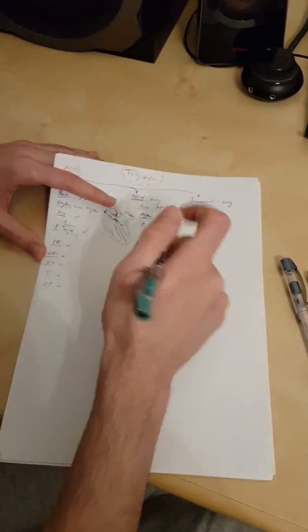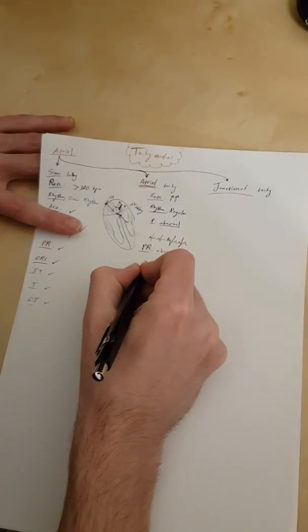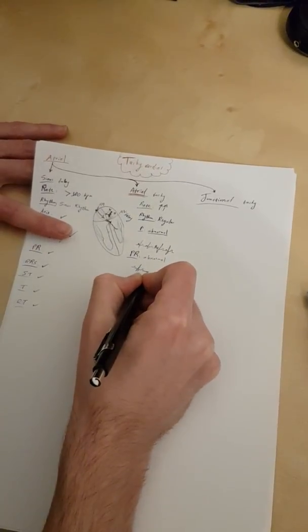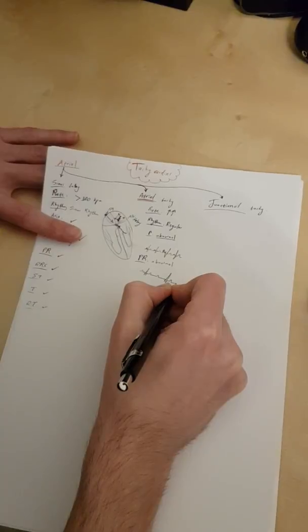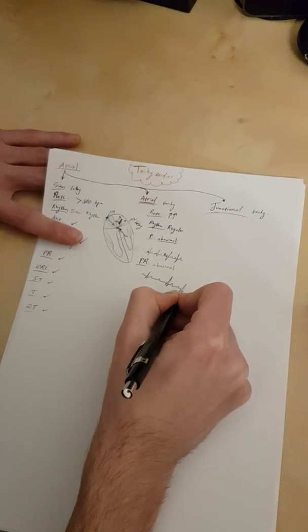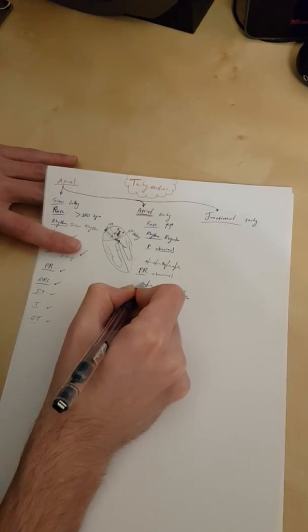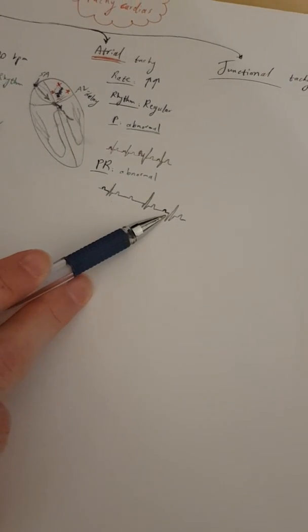So, but I'm just telling you this so you can expect it. So the PR is gonna be also, sorry, this should be in green, okay, abnormal, and this is also abnormal. And here's a hint. There are sometimes you might find in one ECG a P and then a PR, and QRS, then a T, okay? Then you find a P and a long PR, QRS, and a T. And then P, PR, QRS, and a T. Here is the thing. This PR and this PR, the ones in blue. I don't know if you see it as blue or black, but anyways. So these two, this one and this one, are actually normal, but this one is prolonged, right?